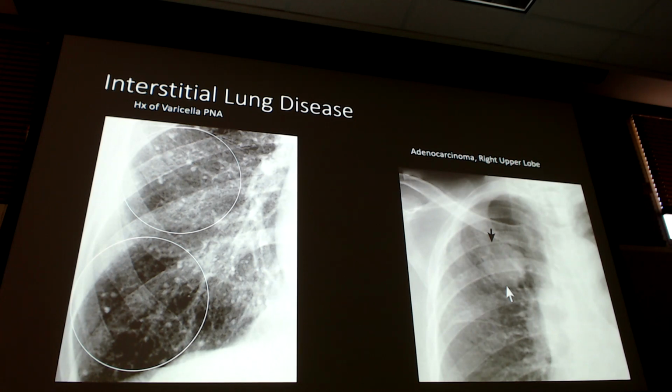So this one here is a varicella pneumonia. Got all the little nodules in there. And for those of you who are like, hey, is this reticular too? It's very possible, right? That's why these things can combine, they can become two at the same time. Typically, if you're seeing a nodular disease from a pneumonia or a virus or a sarcoidosis, it can be both, depending on what stage you catch it in.